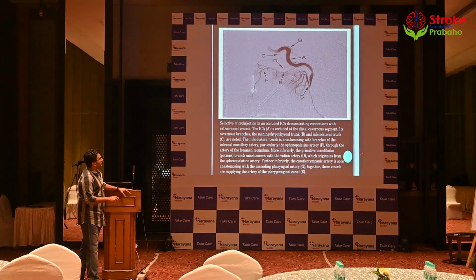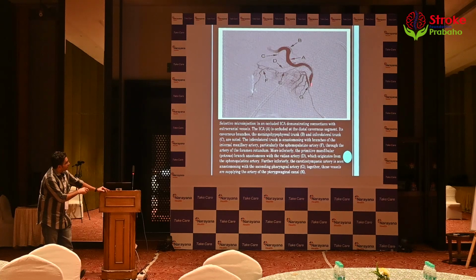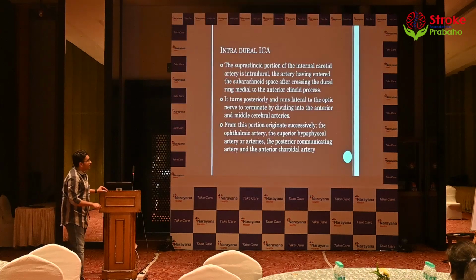So, a recapitulation of the same, beautifully representing a microcatheter kind of injection from the ICA. You can see the ILT branches, and then you can see the meningohypophyseal branches. You can see the mandibulovidian trunk, and you can see the ascending pharyngeal. Just a microcatheter injection of the ICA, reforming your ECAs, and how it's reforming the cavernous. In the mid cavernous, going down and laterally, then going posteriorly: ILT, MHT, mandibulovidian and the pterygovaginal trunk going along the skull base, anastomosing with your ascending pharyngeal.